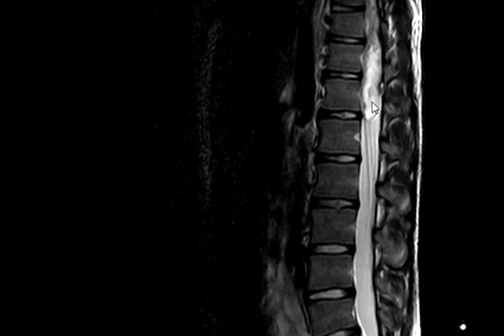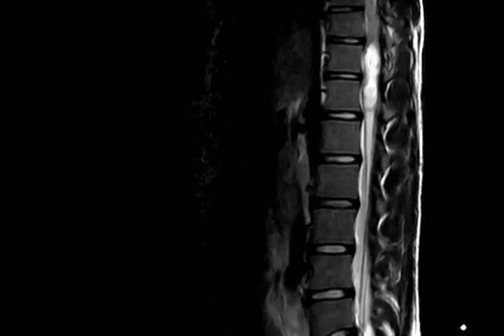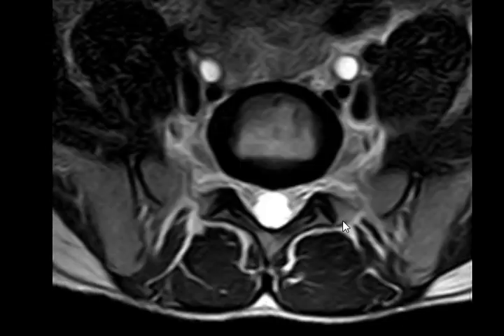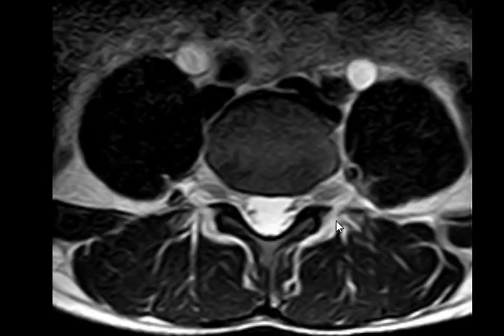Your first mistake, I told you, you have coronal or axial or sagittal or whatever. Why do you start commenting just by looking at the sagittal? I give you a whole meal, you take only the salad. Use everything you have to get the correct diagnosis.